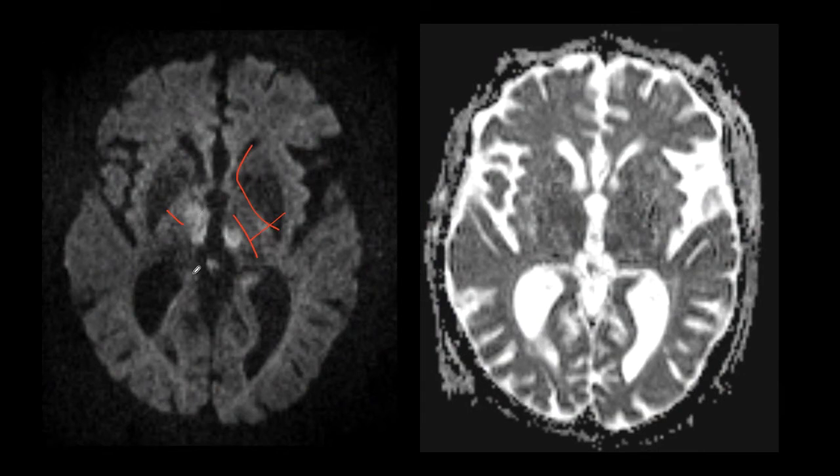So in the thalamus, there's one artery specifically which arises from the posterior cerebral artery, and it tends to supply both the thalami. Can anyone tell me the name of that vessel? Have you come across that? Artery of Percheron. Yeah, artery of Percheron. Awesome. When you see bilateral, we normally tend to think it's going to be two sides, two vessels. But this artery of Percheron, not everybody has it, but when you have it, this is how it looks. So this is an artery of Percheron acute infarct.